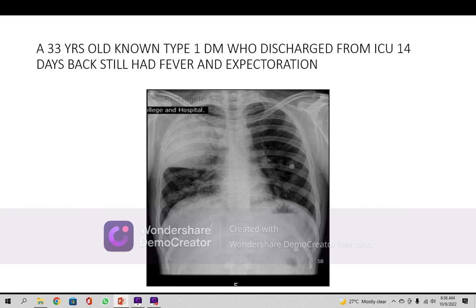The fungal infection can cause this type of lesion. The invasive fungi, specifically speaking in immunocompromised, can present like that. It may be atypical type of the pneumonia, is possible in this case. But the organisms which are not well known can cause this type of picture. And the tumor and the tumor-like states, for example, the bronchogenic carcinoma can present and it is hidden inside this opacity. It is a possibility. You have to discard it if it is after the 4 weeks, it is still there.